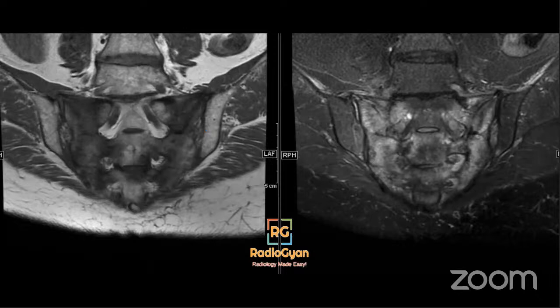These fractures are very common in elderlies, and you'll see them even on your routine CTs. If you're reporting, you'll see these vertically oriented fractures involving the sacrum. Often they're associated with sclerosis, and in the acute presentation, they can cause significant pain. This also has an appearance which is typically described on bone scan. Does anybody know what is the imaging appearance of sacral insufficiency fractures on bone scan?